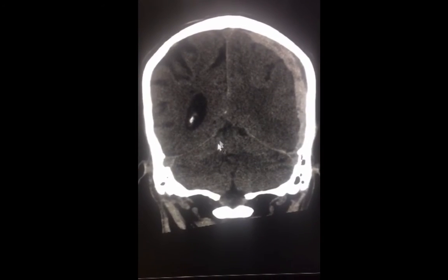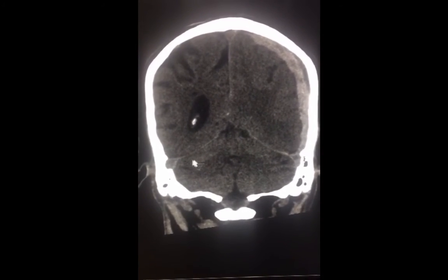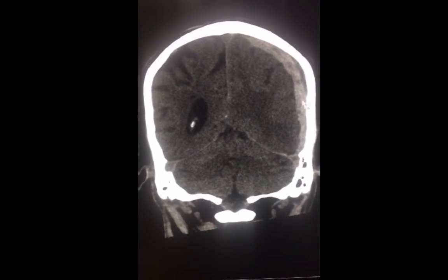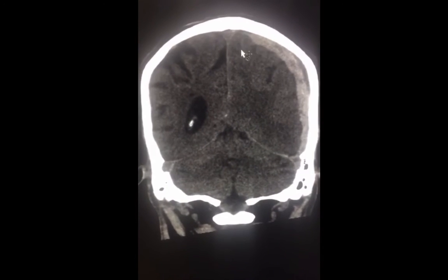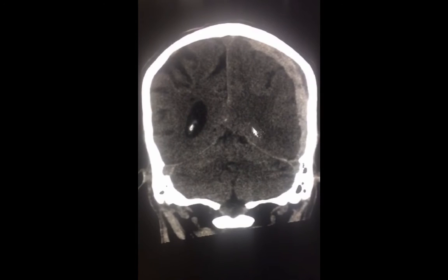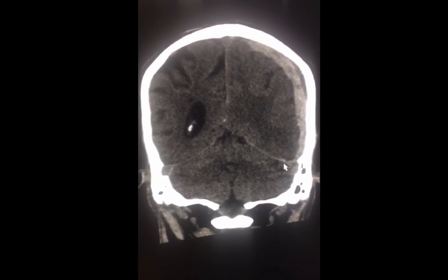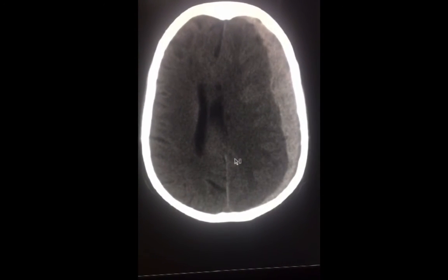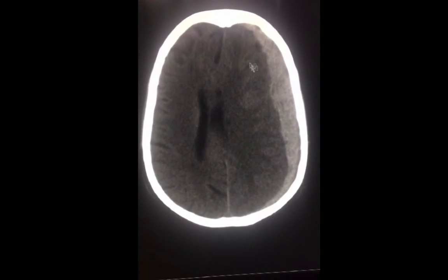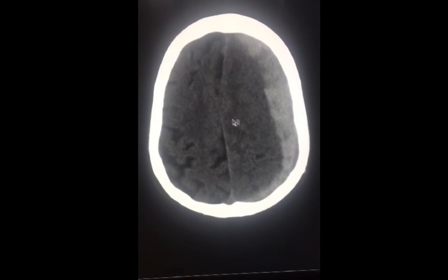On the other hand, epidural hematomas may cross the tentorium and falx, while subdural hematomas like these do not do that. Notice that this subdural hematoma does not cross the falx cerebri or the tentorium cerebelli. Despite the type of intracranial bleed, it's always important to assess for the associated mass effect. There is significant mass effect in this case.